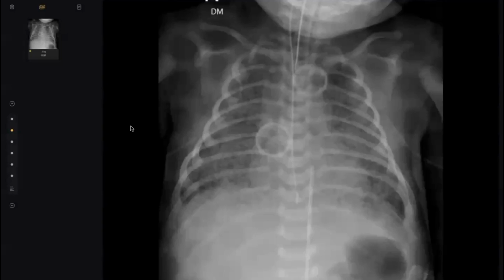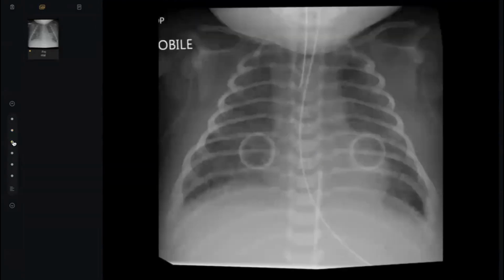What is the underlying pathology of this granular opacity? These are due to subsegmental atelectasis with areas of air trapping and meconium, which are giving these dense opacities. Okay. What else? Does meconium cause something to the lung parenchyma itself? Yes, it causes chemical pneumonitis. Excellent.